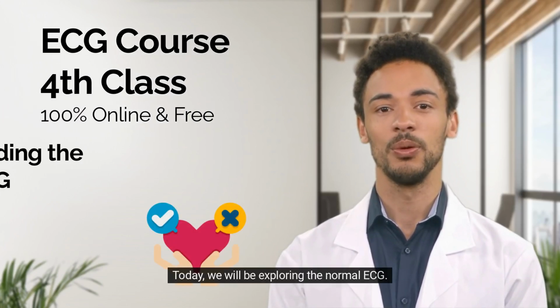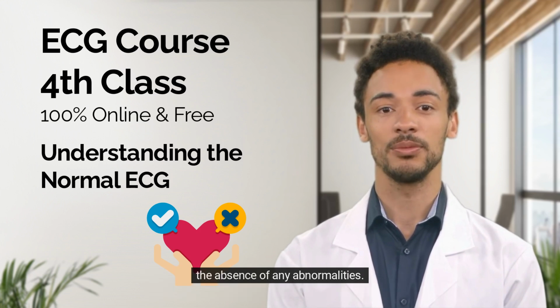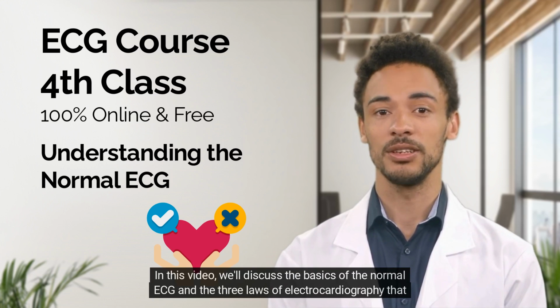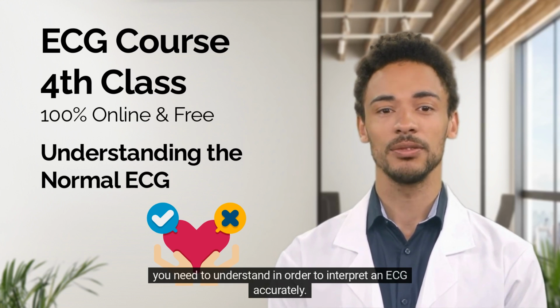Today, we will be exploring the normal ECG. For beginners, the normal ECG can be the hardest one to interpret because it requires you to be sure about the absence of any abnormalities. In this video, we'll discuss the basics of the normal ECG and the 3 laws of electrocardiography that you need to understand in order to interpret an ECG accurately.